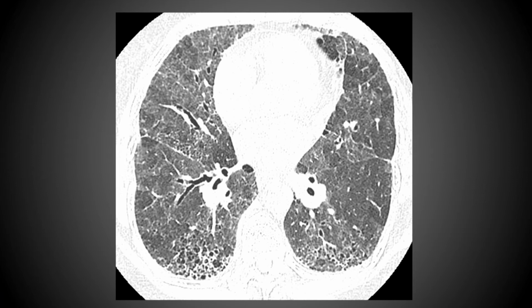If, on the other hand, you can retrieve prior CTs that will show you more of a typical DIP pattern, then I think you could make a more confident conclusion that this represented a fibrotic stage of DIP and avoid a surgical biopsy at that point.